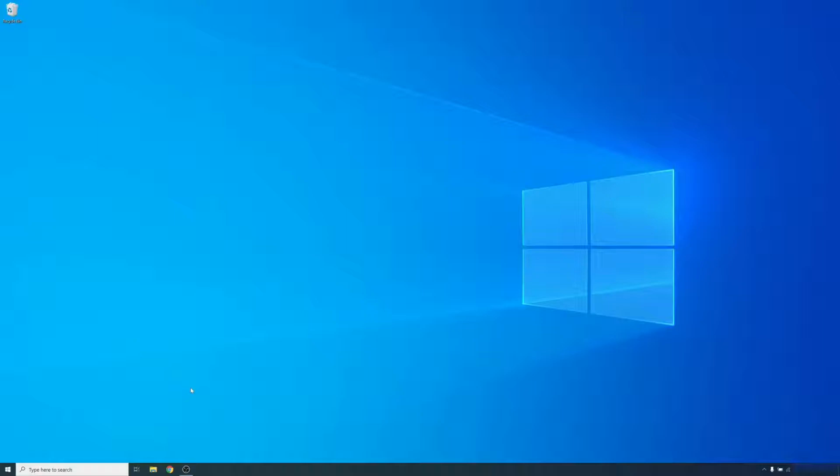Hi, my name is Cole, and today we'll be taking a look at Parsec, a low-latency remote connection program that works great with EEGer home use. This video will cover everything from installing Parsec on a Windows computer to using it in session. Timestamps for each section can be found in the video's description.